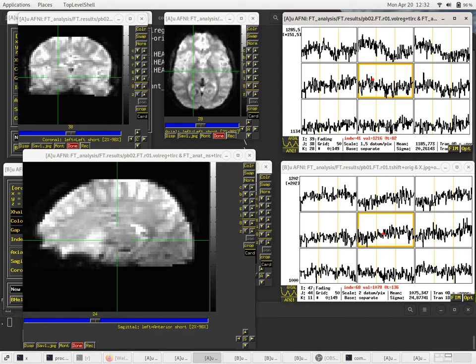That affects slices differently. So slices 0, 2, 4, 6, 8, 10, 12 are acquired, but then 14 is a little rotated, 15 is more rotated, 16 is more, 18 is even more, and the rotation progresses. And then perhaps if it's a net head bob that returns to the original position, you might have slices coming back to the original position afterwards.